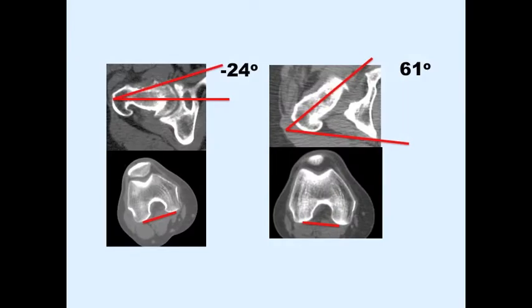You should also know that the default plan deliberately does not incorporate measurement of femoral anteversion. This is primarily because the anteversion of the femoral broach achieved in surgery may not match the native femoral anteversion. This means that the femoral anteversion should be determined by the surgeon intraoperatively.